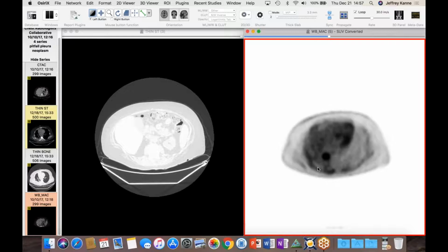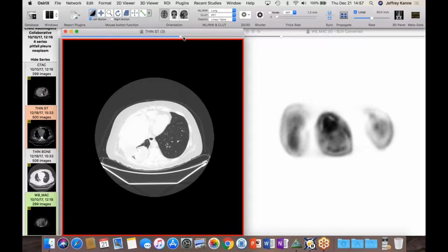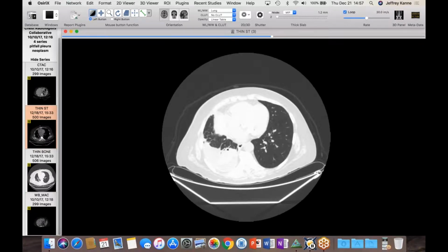One of my colleagues shared this case, but I'm almost positive it's histologically proven. And the other thing is the metabolic activity is distinct from the rest of the peripheral portion of the mass. It's only that solid component, which would be a little unusual. So this part right in here, it's not involving the lateral portion, which is the rounded atelectasis. And I guess you could get a rounded atelectasis from a tumor because you could get a pleural reaction to it, pleural thickening or fixing of the pleura that could lead to it.